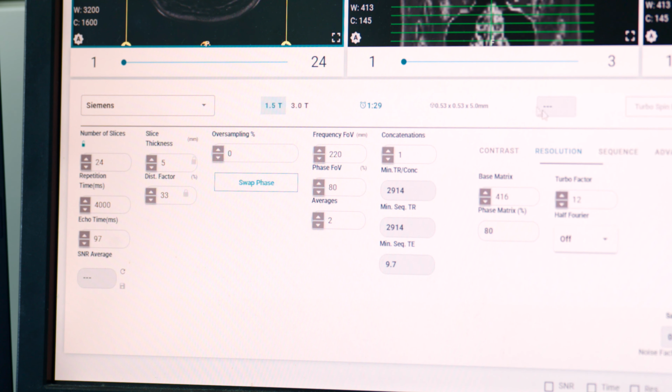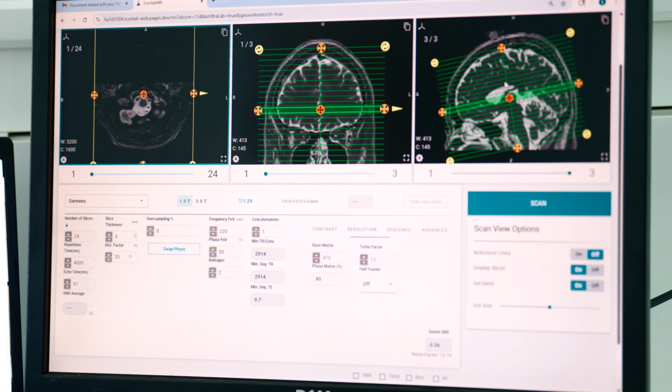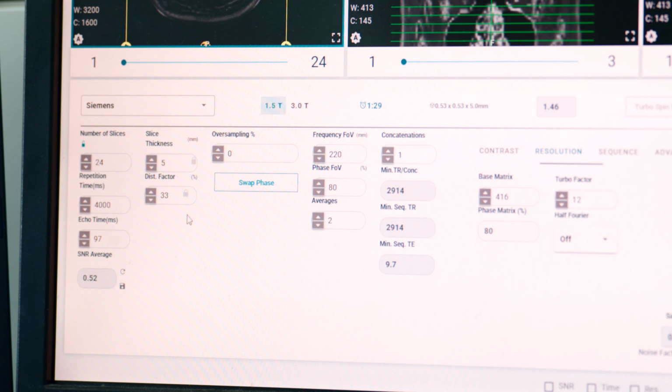Normally, it would be no change, but for us, I'm going to recalculate this, and it will tell me, based off of the exact same slice geometry, it's going to go through slice by slice, and because some of these slices are actually containing cerebral spinal fluid, which has a long T1 recovery time, you'll see that just making that change in these slices from 3,500 milliseconds to 4,000 milliseconds, I've seen a very large change in regards to my overall SNR.